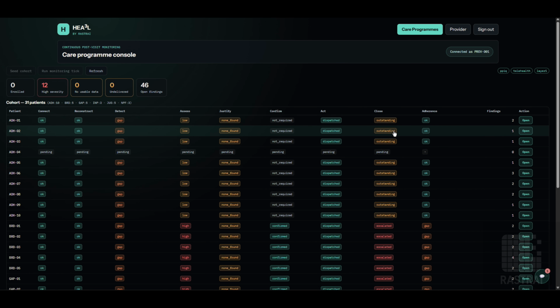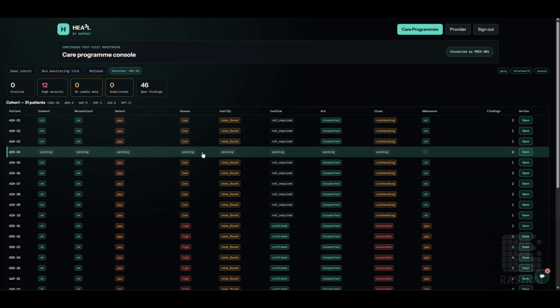Following the analysis, HEA³ brings together the imaging findings, measurements, and supporting visual evidence into a structured comparison result. This is supported by HEA³'s priority journey and risk analysis layers. The clinician can review the evidence, make any required changes, and prepare a draft report while retaining full control over the final interpretation and sign-off.